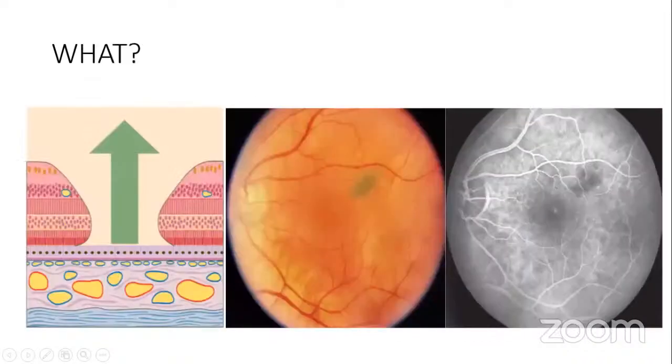Okay. So now this is clear for everybody to understand. This diagram just shows you that there has been a full thickness retinal defect involving the macula in this patient. So, macular hole. So you see it on the fundus photo. There's a hole here. I would have just asked, as an interactive section, which phase of the angiogram is this? But I'll show you how to know which phase it is, okay?